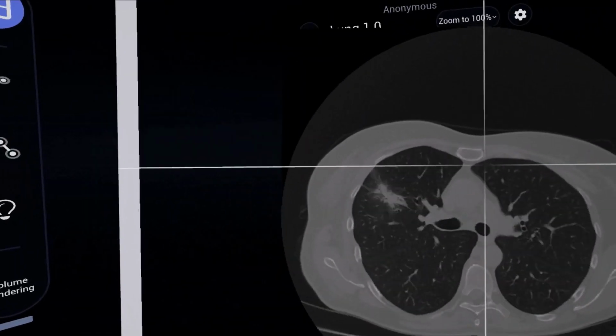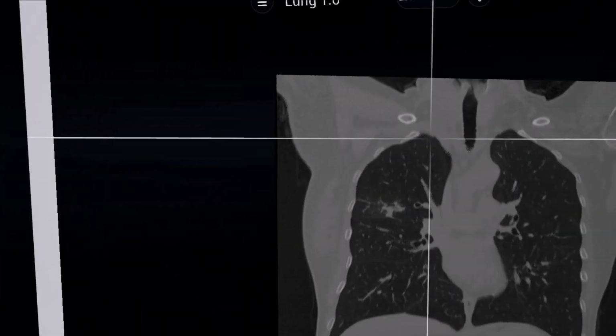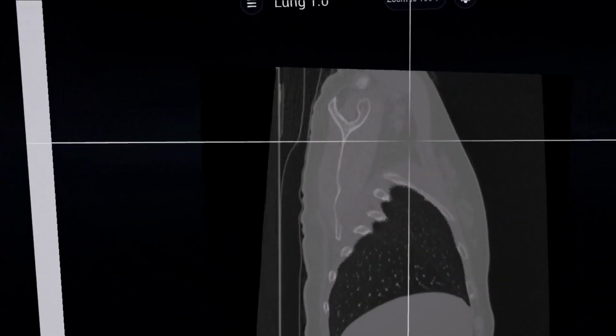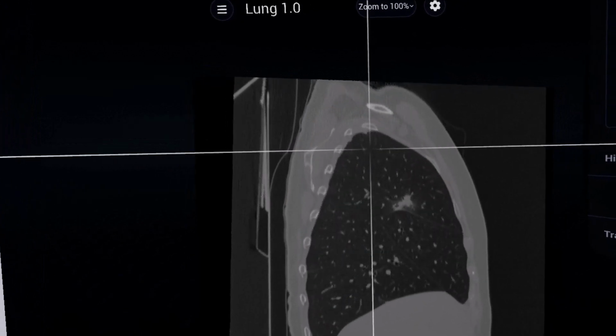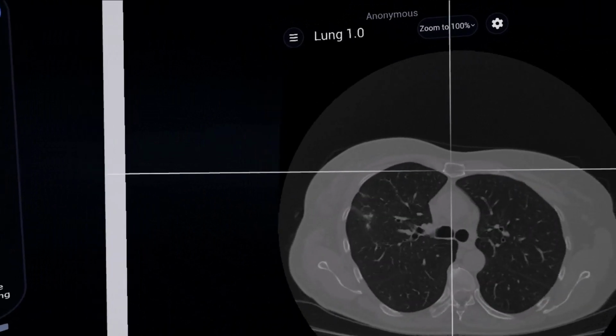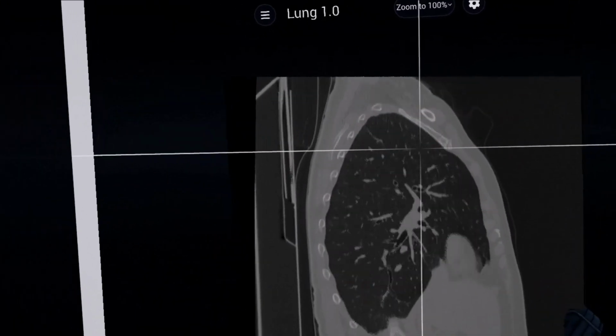An example of a computed tomography, CT, of a patient with right upper lobe lung cancer. Thin-section pulmonary reconstruction can be assessed in the scanned axial plane using just one smooth joystick movement. In addition, evaluation in other planes can be performed by simply rotating the volume by hand at the desired angle, which is much faster and more convenient than using the mouse and various buttons in a conventional viewer.